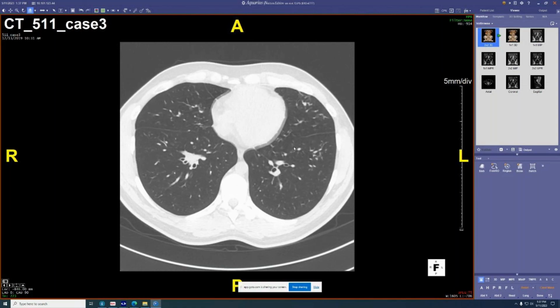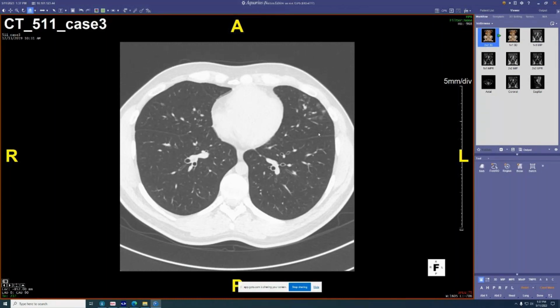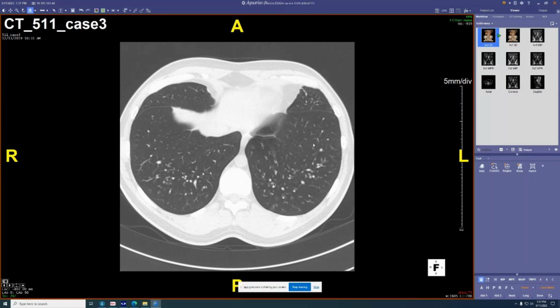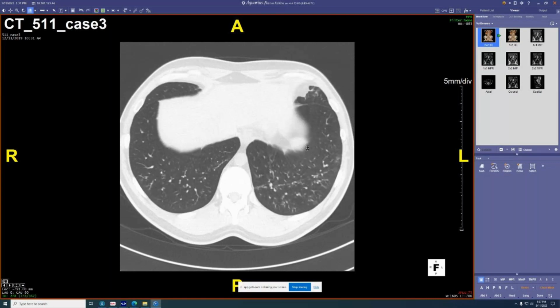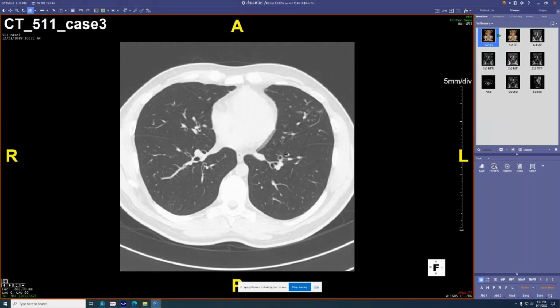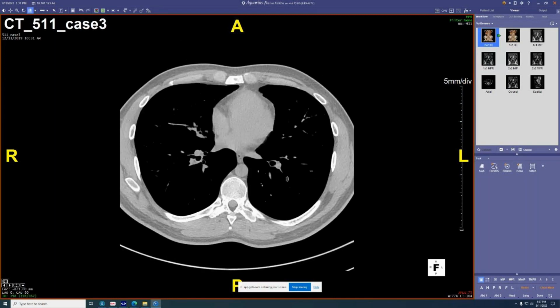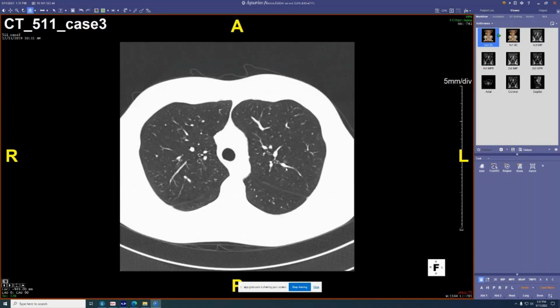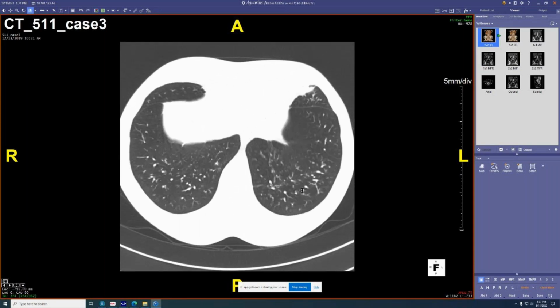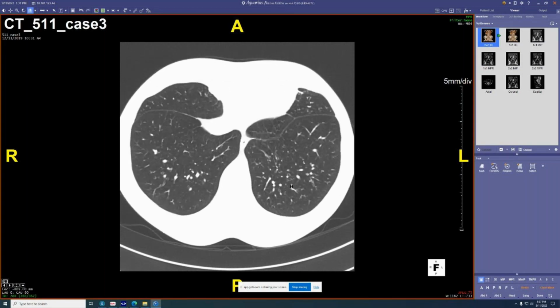Anyways, he has yellow nail syndrome. So yellow nail syndrome is one of these weird things where it's some sort of lymphatic abnormality. And somehow the lymphatic abnormality leads to, I don't know if it's the plugging of the airways due to some sort of impaired lymphatic drainage. I would have to do more research on it, but they often present with effusions, which would be consistent with lymphatic drainage abnormalities. I'm sure one of you knows more about it than I do. But the imaging, I saw the case, I was like, oh my God, it's going to be amazing. And it just was kind of tree-in-bud, which I guess is pretty common.